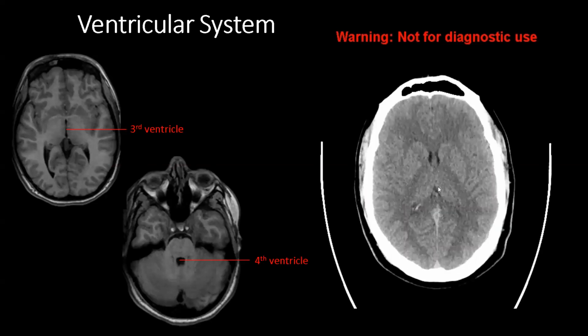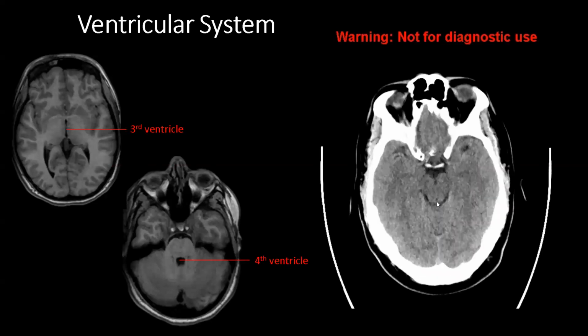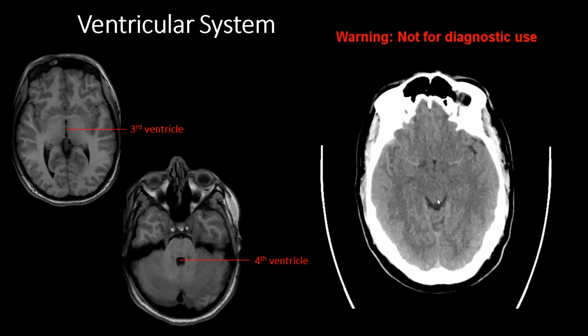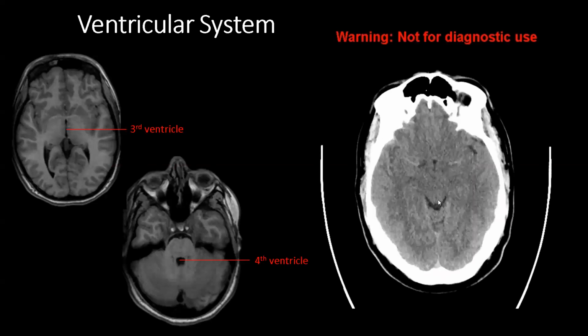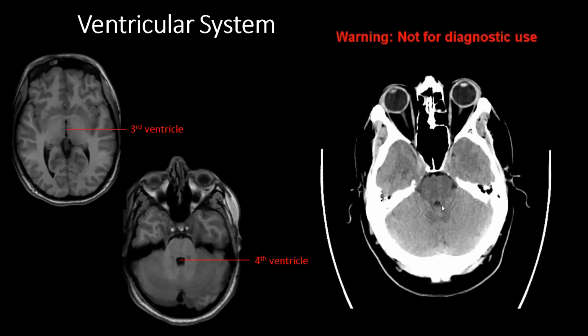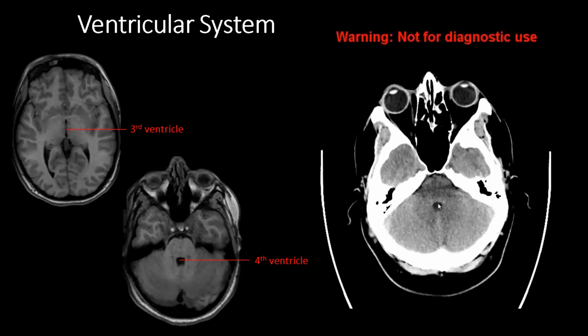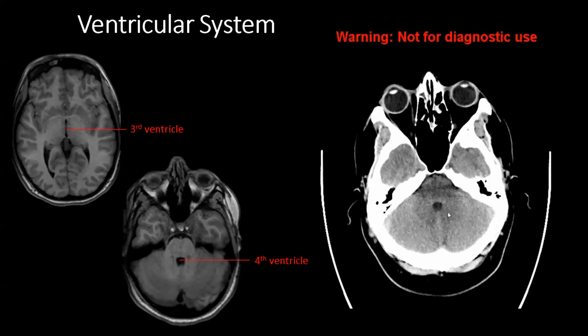As we continue to follow it inferiorly, we then come into this structure here, which we already alluded to when we were talking about the midbrain. It's the cerebral aqueduct traversing the midbrain, draining CSF from the third ventricle. And if you follow it down, you can see it connects to the fourth ventricle, which is a slightly dilated structure as you reach the cerebellum, which is housed by the cerebellar hemispheres, and anteriorly the pons. So that's your fourth ventricle.